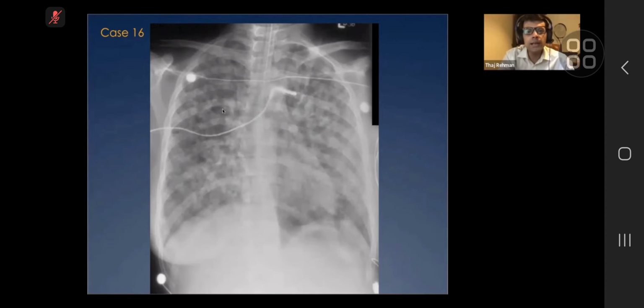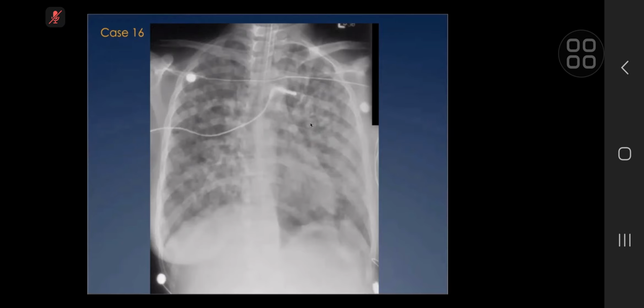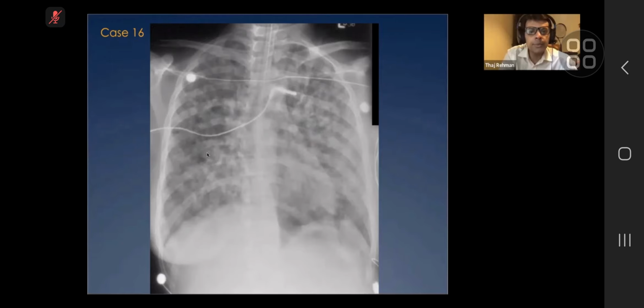Varicella pneumonia, this degree of acinar opacities is a kind of classical appearance of varicella pneumonia. Okay, so keep that in mind. Is that okay? Yes. Acute varicella pneumonia, extensive and widespread acinar opacities.